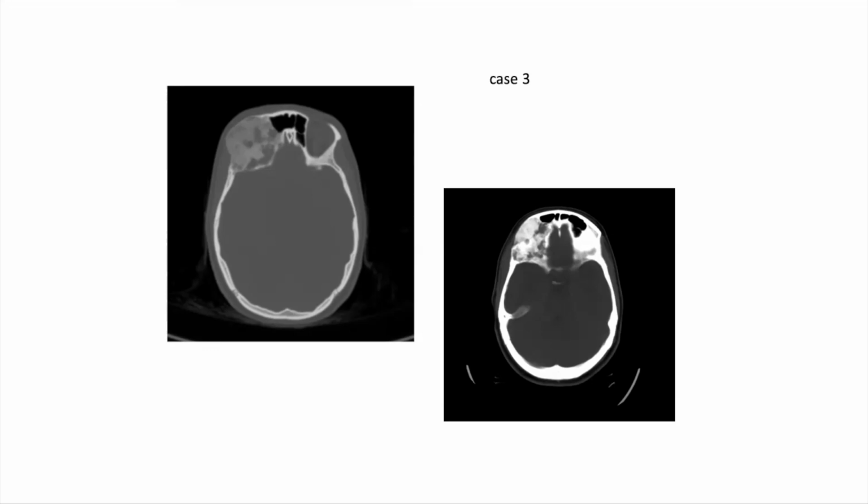Well, I think this is a very fair assessment, and I understand why the answers are there, but I think we're in the right family of disease, fibrous dysplasia and intraosseous meningioma. Now, this proved to be fibrous dysplasia. The features that make you think about fibrous dysplasia is that you notice that it has a very smooth border, unlike that other case I showed you that had that kind of hair on end appearance. So this has a more benign appearance.